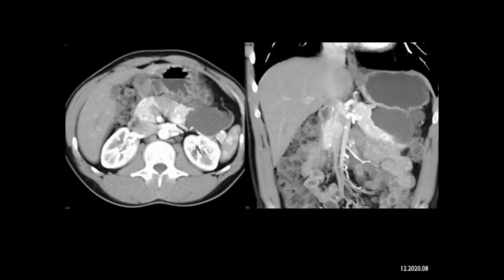In this case, I ask the question, what's the least likely diagnosis? Now, we see a cystic lesion that's off the tail of the pancreas. Well, serous cystadenomas, it could be. It could also be an MCN. It could be an IPMN. But you also need to consider lesions that are exophytic to the pancreas, lymphoepithelial cyst. That's a great possibility.